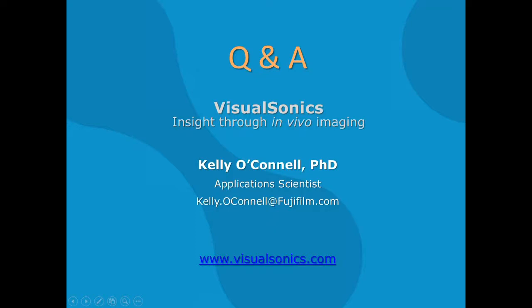That's been your experience as well, Kelly? Yeah, absolutely. You want to make sure that you don't have shadows in your image. And when you create your tracing and you enter the strain software, you can review how well it did just visually. So if you play through your video, you can see that perhaps your tracing fell off at a certain frame area. Keep in mind to double check your strain tracing and make sure that it actually did a reasonable job. And if not, just go back and redo it. Mm-hmm.